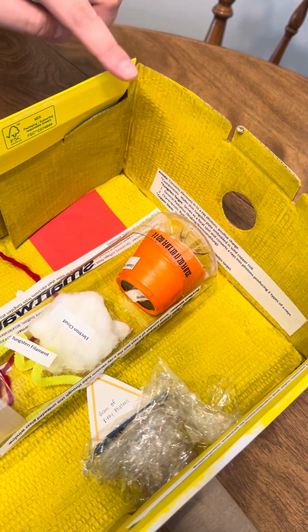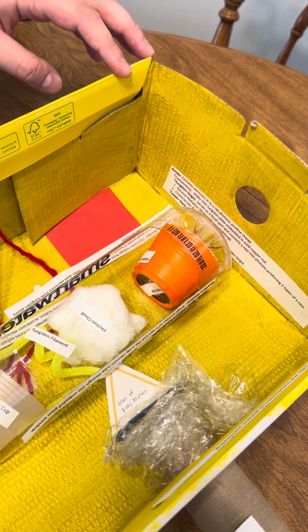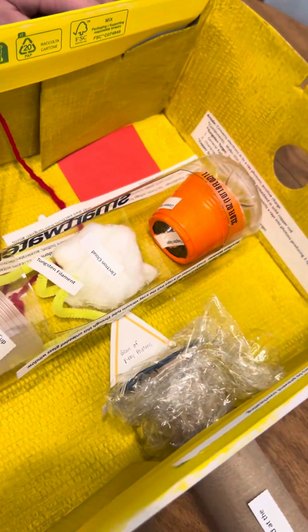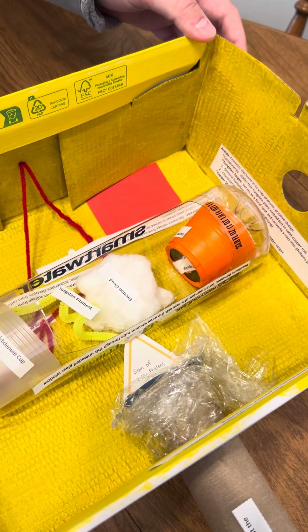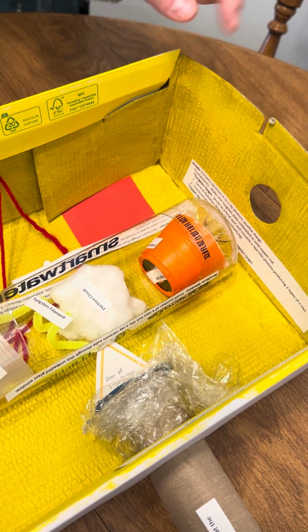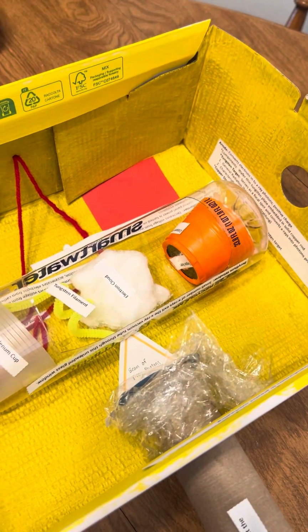On this end, we have the anode, which converts the electrons into the X-ray photons with a positive charge. We have the tungsten target, which is up there, which serves as a focal spot and converts electrons into X-ray photons, producing two types of X-rays. We have general radiation, which is also known as braking or bremsstrahlung, and characteristic radiation. The copper stem dissipates heat away from the tungsten target.